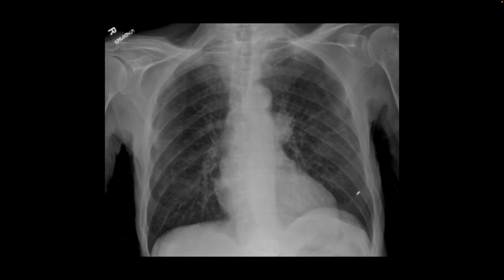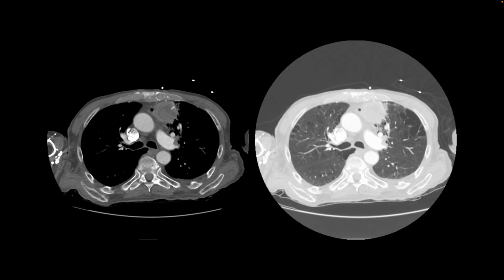Here's a companion case. Again, the lung fields are predominantly clear except for this ill-defined opacity or fullness that is just superior to the left hilum. And so again, here the next step should be a follow-up CT chest, and this patient had a mass in the anterior aspect of the left upper lobe, seen right here, and also here in the lung windows, see the emphysematous changes from smoking, seen in both lung fields.